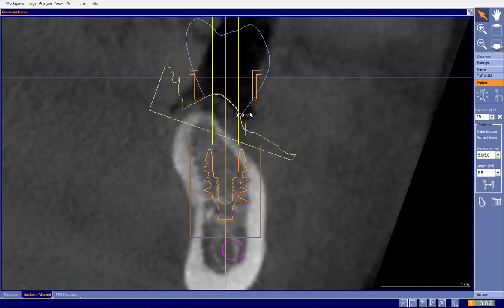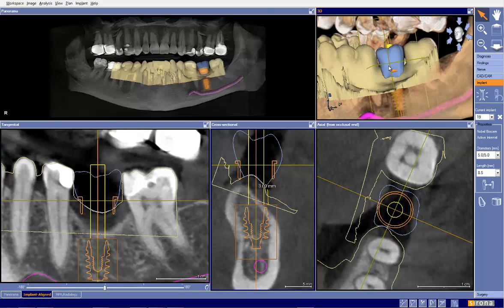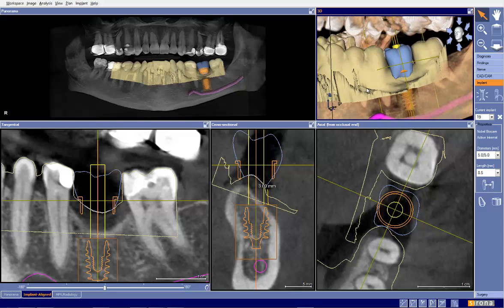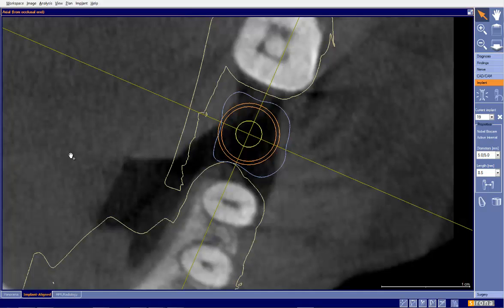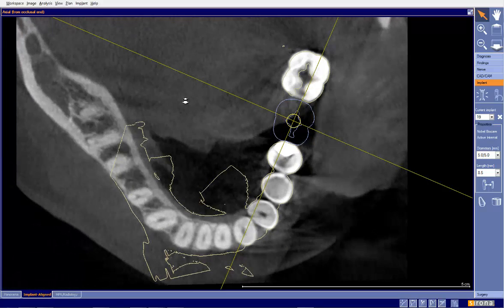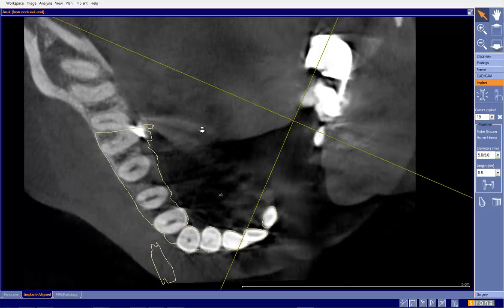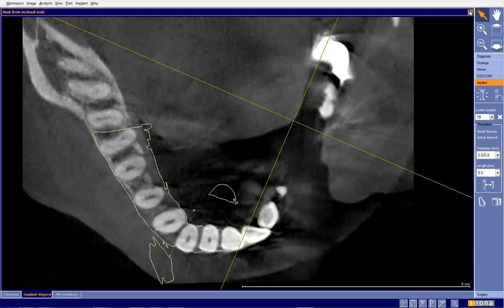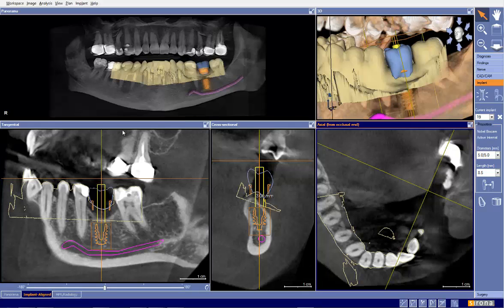In this particular case, you can see the dentist used the 3 millimeter rule to determine the placement of the implant. But if this implant restoration was designed too long to begin with, as we can clearly see here, then we're measuring the 3 millimeters from a wrong spot. So I do want us to take a closer look at our CEREC plan when we're doing these. Let's check the accuracy of our integration, and it looks very, very good. So we can verify that this is a good case to send for an Opti guide.